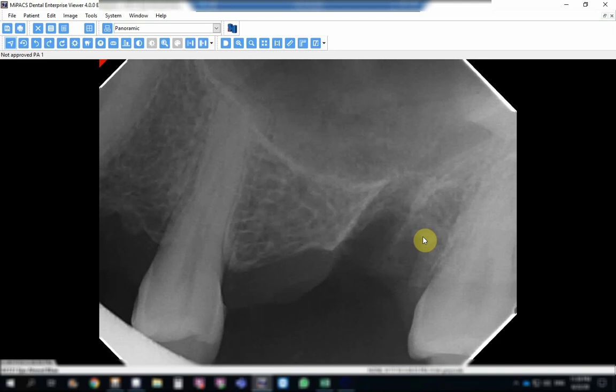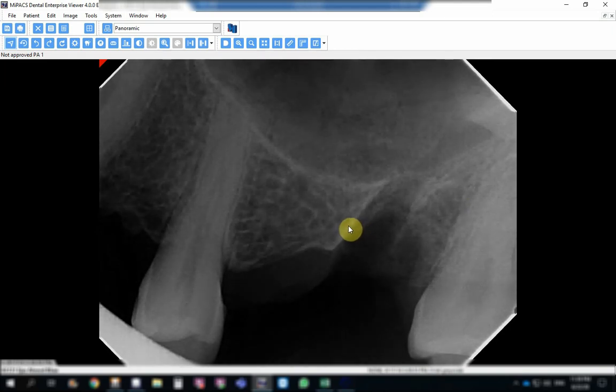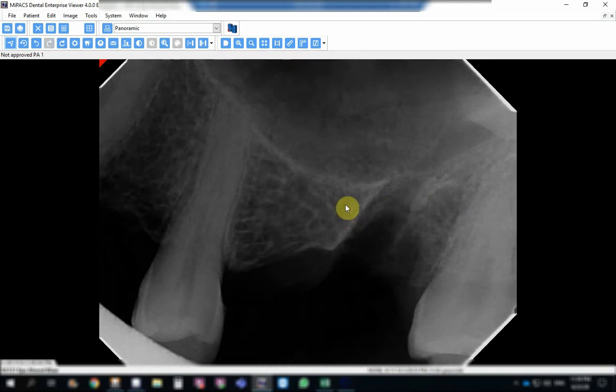But what we want to see here is how it would look. Of course, this will also be affected by the quality of the radiograph. Now, if you increase the density of the radiograph, you can still see the flow of the sinus over here continuous, but in this area there is a discontinuity in the distal buccal region, which means that the discontinuity of the flow of the sinus was in this area. Thank you very much.